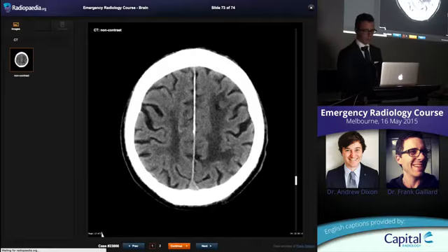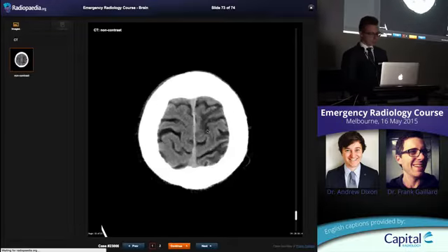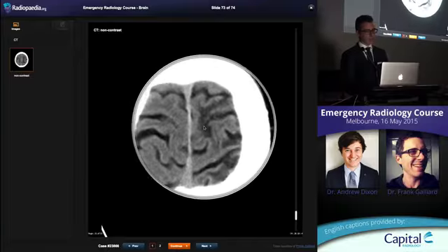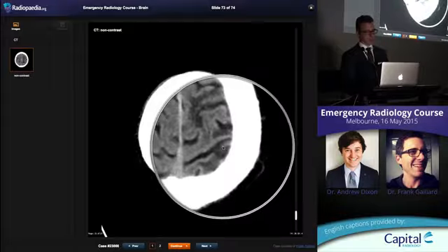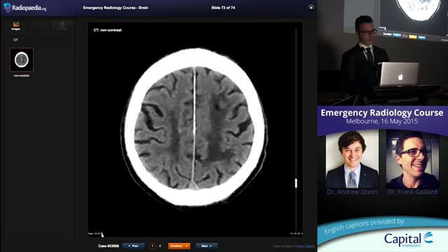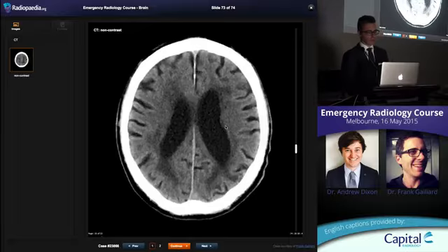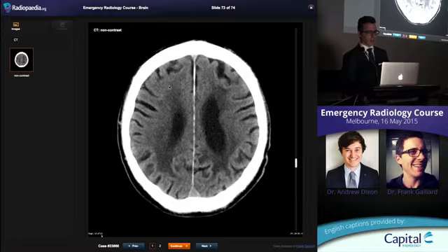And so if we have a look at this patient who was imaged incidentally for something else, had headache or something, we can see that in the past they've had cortical infarcts, bits of cortex missing with volume loss and gliosis. Here's another little chunk of cortex missing, and back here there's a gap. And if you look at the distribution, it follows that border zone between anterior cerebral, middle cerebral and posterior cerebral further back, with the central parts of all of those territories being very well preserved. They've also got chronic small vessel ischemic change, seen as patchy, low density change in the white matter bilaterally.